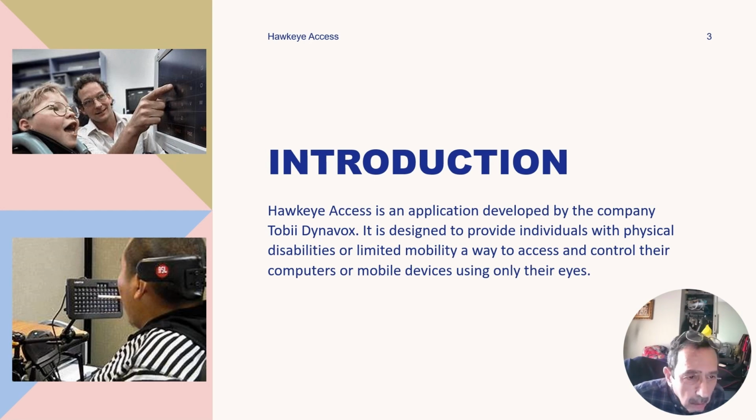So, HawkEye is an application developed by the company Tobii Dynavox. It's designed to provide individuals with physical disabilities or limited mobility a way to access and control their computer or mobile devices using only their eyes.